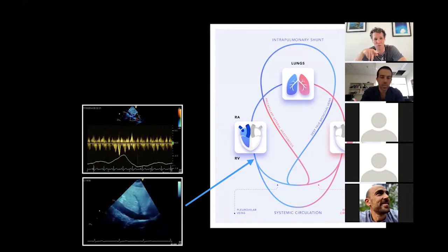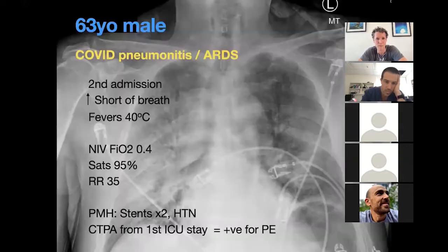If you've got one like this, where both systolic and diastolic pointing down, with the systole being bigger than the diastole, that's again suggestive of normal right atrial pressure of less than 7. And if you've got systolic flow reversal, that would be suggestive of greater than 15. And of course, it can be even higher than that. All right, let's go through this interesting case because I think this describes quite a lot of what we're doing.